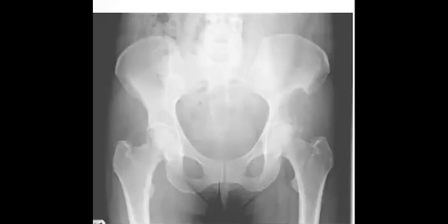Perfect, Rabab, Shayma. So you will think that could be metastasis. I see, Shayma. Yeah, it can be metastasis. It can be metastatic. There is cortical breaching, and it can be metastasis. Then the question will be, if it is a lytic lesion metastatic, which tumor would be the primary?